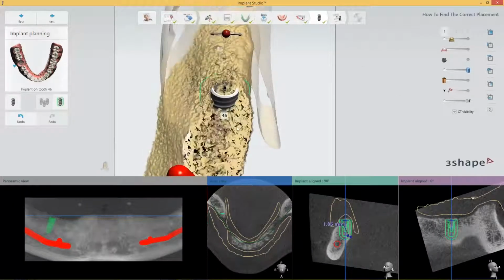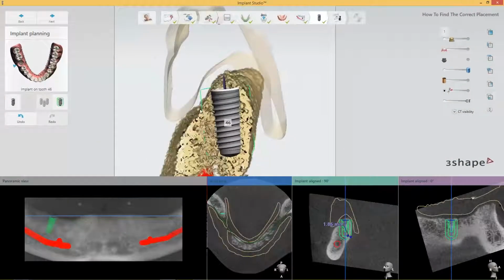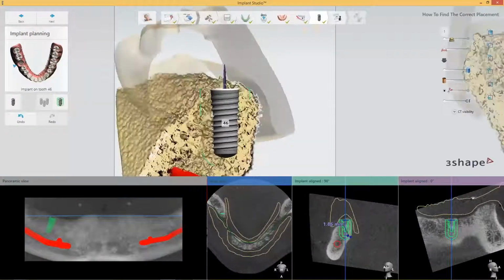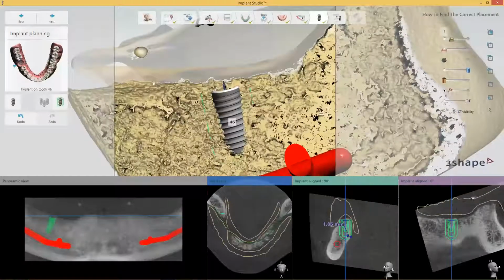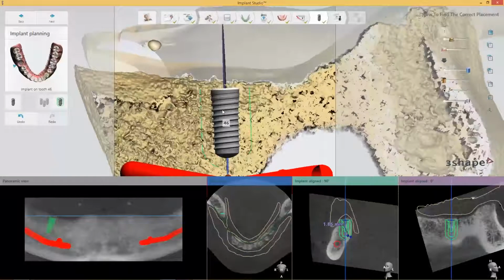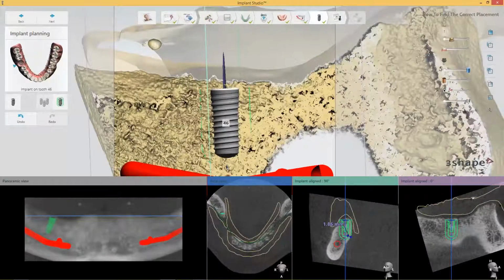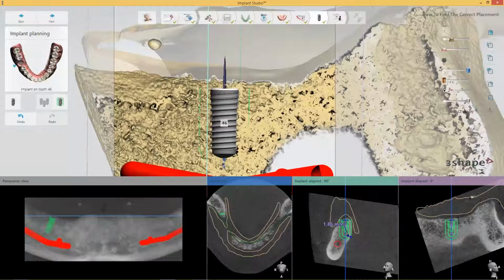So 2 millimeters surrounding on every side, bone covering on all sides, and a good distribution by following the axis of the bone. So if we place this straight, this is now in a level, and there we have it. And then we have the implant almost also in a level. So if I just go in here and change this, we see how it works immediately everywhere, and I can position it perfectly. So whichever window you are working in, it works in all windows. So it's good.